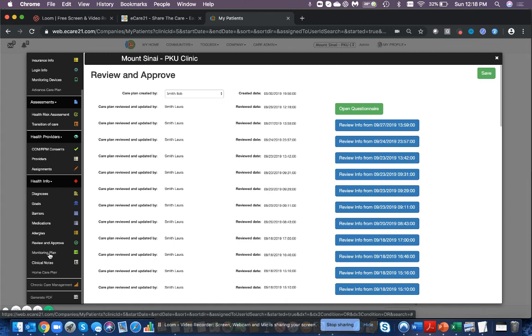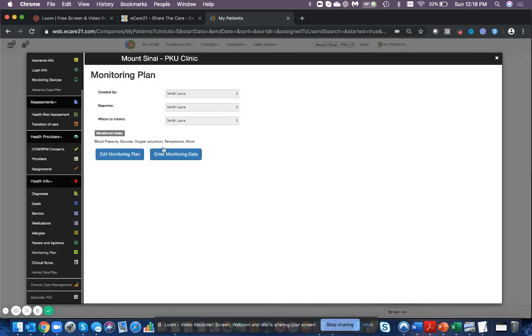Next, I'm going to show you the monitoring plan. And I'm going to show you, in a separate video, how to edit the monitoring plan and how to enter monitoring data for this patient, and then to periodically follow up and review the patient's trends and how they're progressing towards their goals. Thank you.